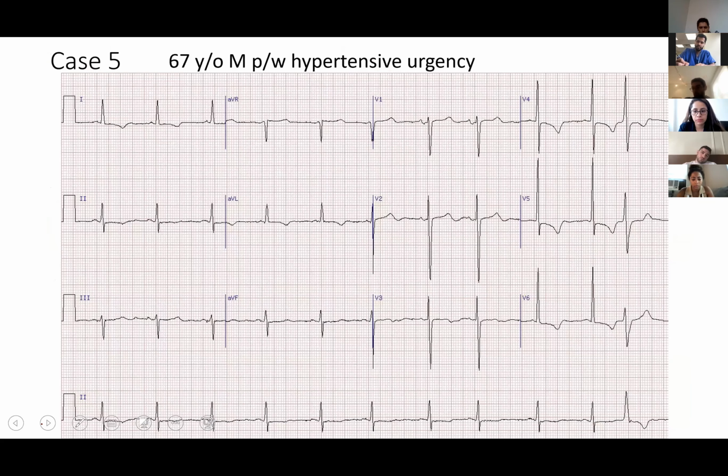Okay, I see this one. Sharel, just turn right away. Tell me what you think. How would you go through it?